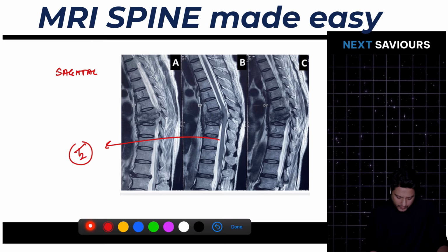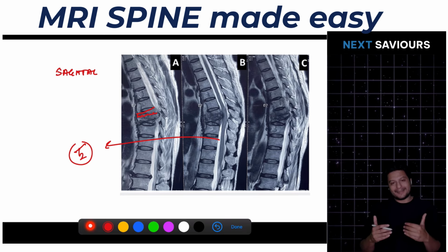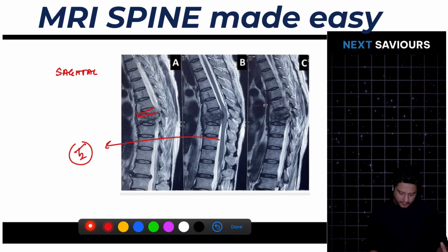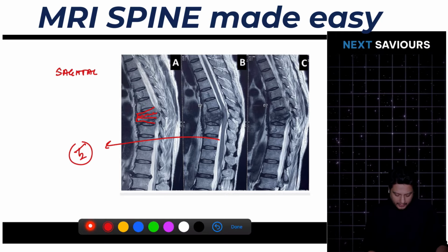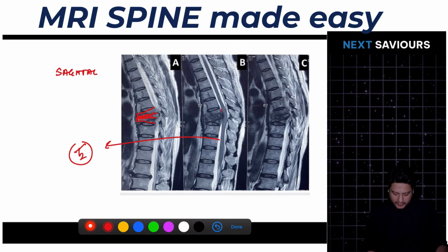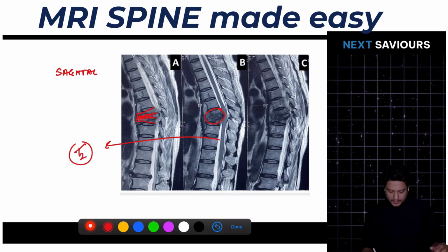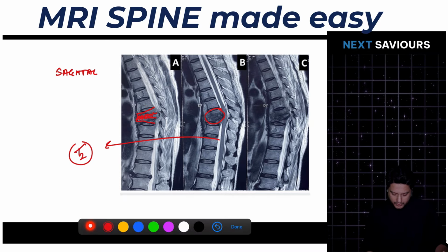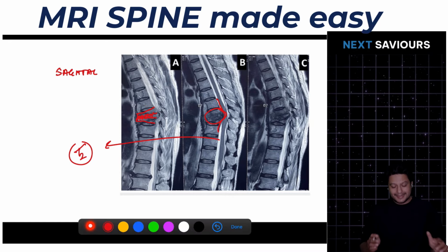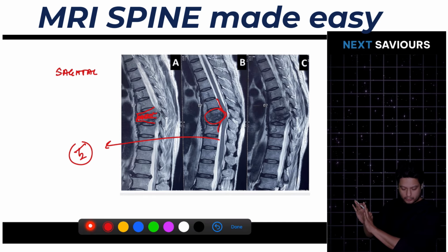And the third is the positive finding. Now, if you look at these vertebrae, here the vertebral body is getting degenerated. It is getting eaten away by the organism. Similarly, another vertebral body is also getting disintegrated, and there is a complete reduction of the disc space in between the two. Not only is there a complete reduction of the disc space, there is also a protrusion of these fragments into the posterior column, thereby causing a thecal sac indentation. That means they are compressing the cord also.